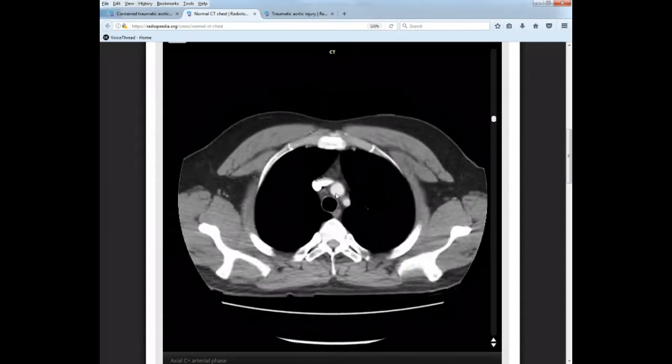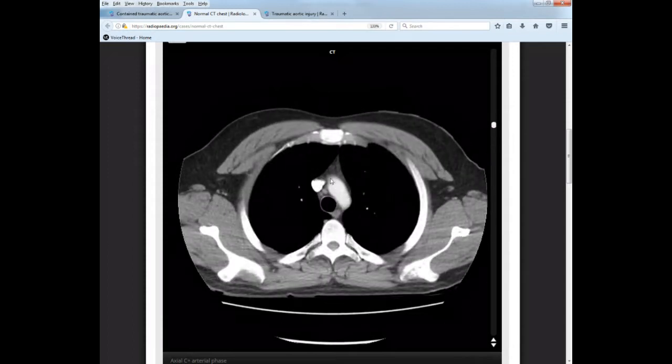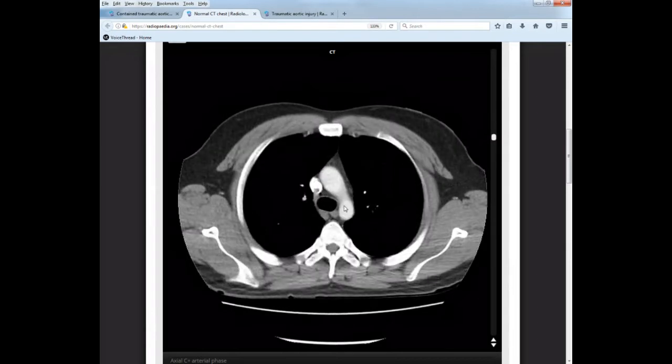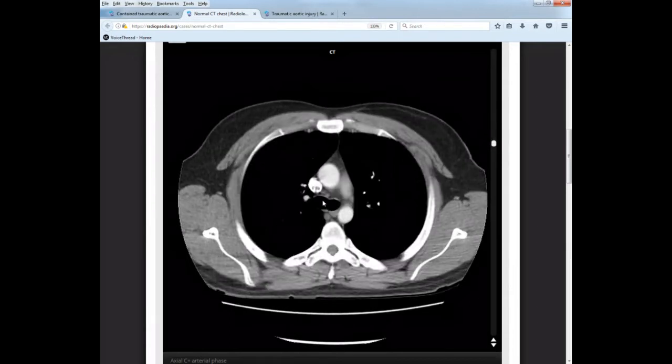So if I were to travel up, this is the aortic arch coming in here. So ascending aorta is then going to candy cane over and become descending aorta. So there you go. There's your arch going down like your candy cane. Our carina right here. So I'm just starting to bifurcate my trachea into my right and left main stem bronchi.